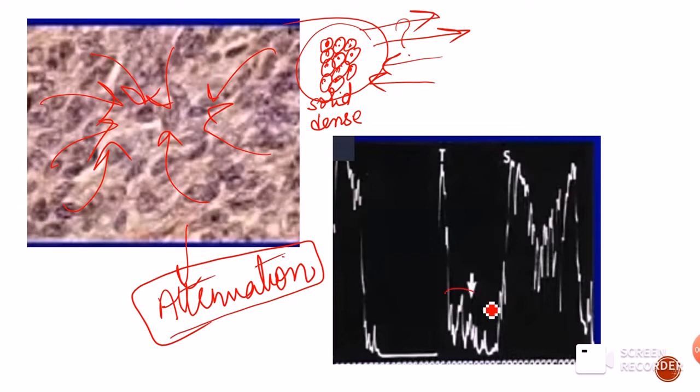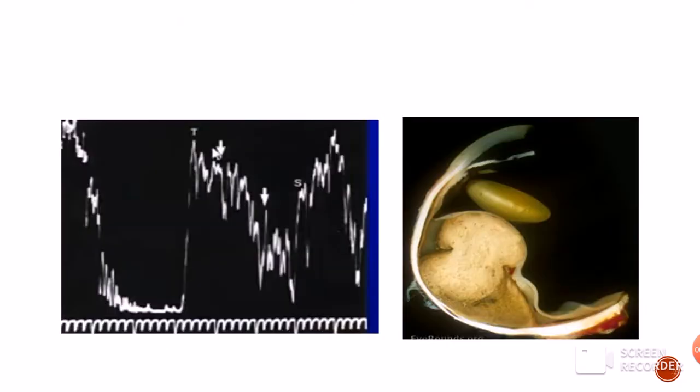Now since absorption is more than the reflection, the echoes that we are getting in case of the choroidal melanoma will usually be very low echoes or medium dense echoes, right? However, in the beginning, as the sound waves are going to strike the surface of the melanoma, we are going to get a very tall spike, and later on the spikes are going to reduce. Now let us see why do we get that tall spike.